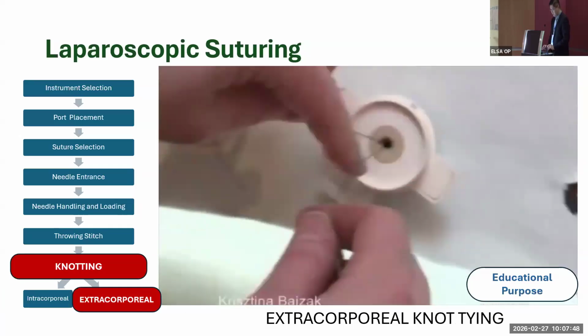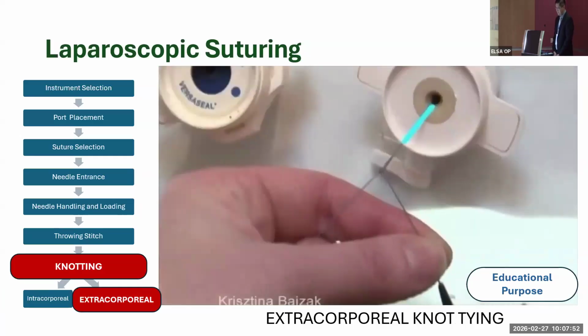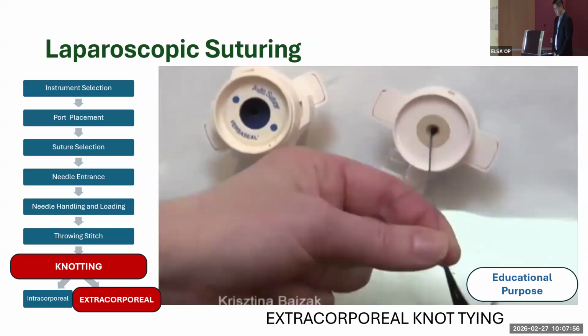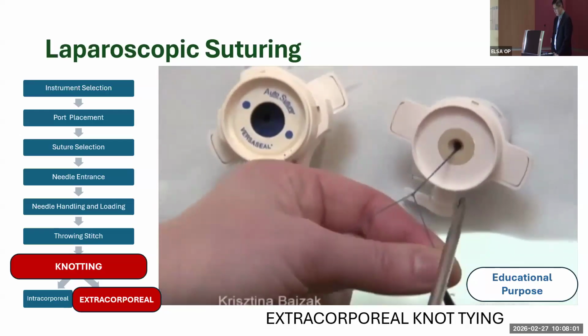And now, let's move on to actually tying the knot. We'll do our first throw. So the important thing here is the Y. And the reason the Y is important is we can loosen tension on one side or on the other, depending on how the knot is running.